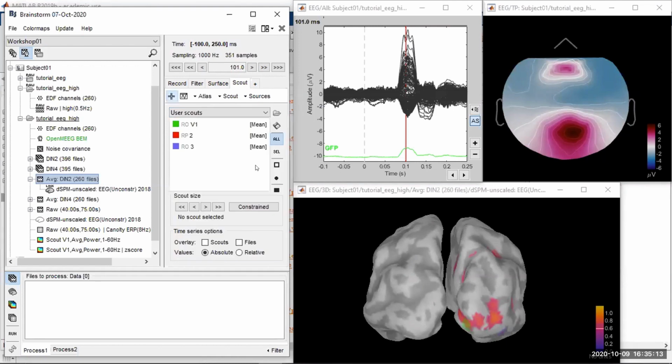So if I click this little crosshair here, let's say that this region seems of interest to me. So I just clicked on a specific vertex here, so it's only a single point, but I can actually grow this region manually myself. Let me make it clear now. I haven't named this region anything meaningful, so it's just 4 here, but I can grow this region.